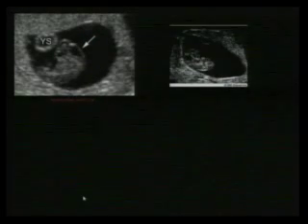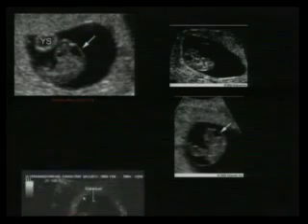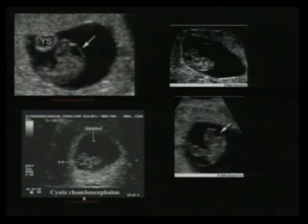Here's a couple of examples, and here's our yolk sac. Here's our rhombencephalon, so basically this is the head, this is the butt. Another example here, another rhombencephalon. Another example, again, it almost always looks like this. It's going to be located posteriorly like that. Another example here, and you can just catch a glimpse of that amnion there. Here's the rhombencephalon. So here's the head, there's the butt.